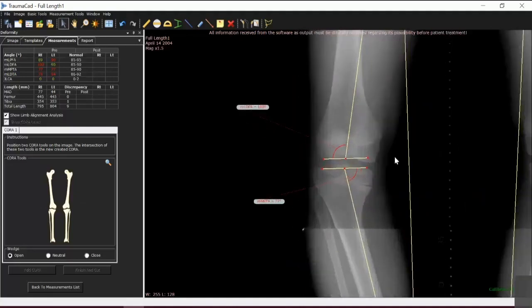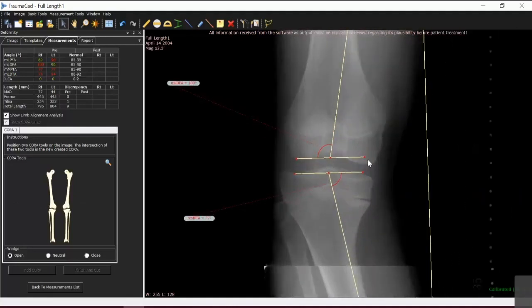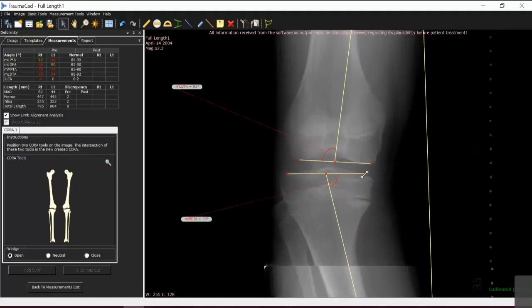So we'll go to the knee on the right side. As I said, we're just going to concentrate on the right side. I'm aware there are growth plates here, so we wouldn't necessarily be doing an osteotomy on an adolescent, or this particular adolescent, actually. So let's just use that.